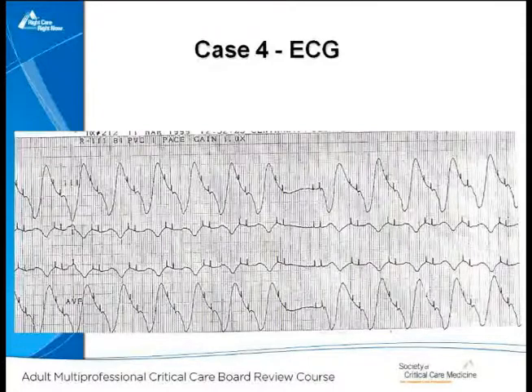And so which of these answers is going to give us that? Well, digoxin toxicity actually enhances automaticity and excitability, so it doesn't cause you to lose capture. It's not oversensing because there's a pacing spike. The battery, I guess, could be running out, but usually this is not the pattern of battery depletion with a pacemaker. It usually goes to a fixed rate.